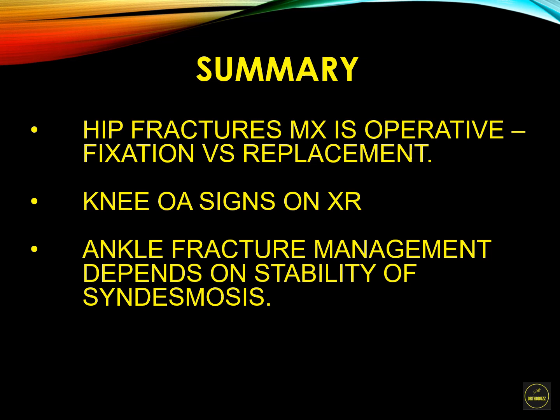Knee x-rays should be weight bearing if we're looking for signs of osteoarthritis, and we can remember the four signs such as loss of joint space, osteophytes, subchondral cysts, and subchondral sclerosis. The treatment options are always non-operative versus operative, and they range from lifestyle modifications, steroid injections, physiotherapy, all the way up to having a total knee replacement.